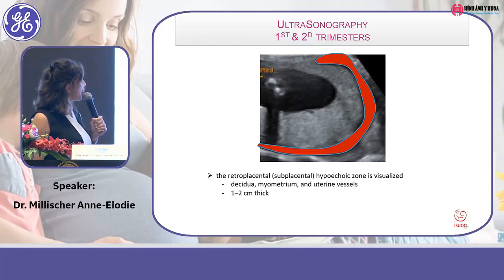Which is different from the myometrium surrounding the placenta.